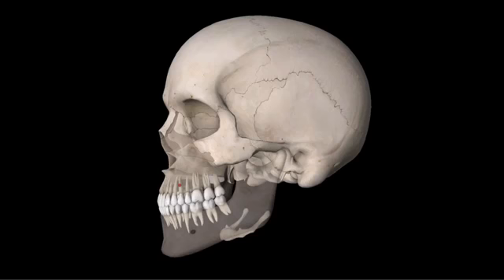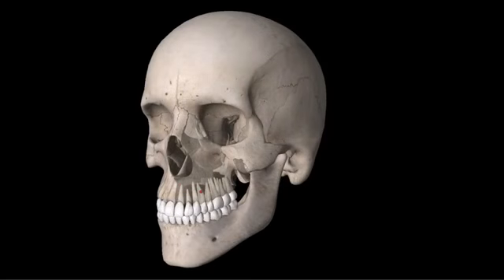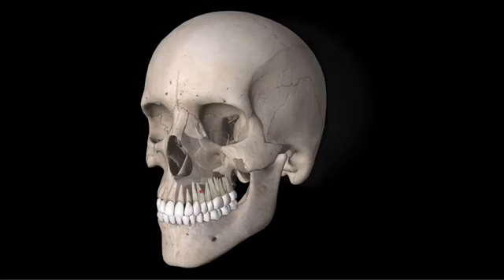Let us visualize this in 3D. Here is our base image, and as we move more mesial, showing more anterior teeth, the buccal side is going away from us and the palatal or the lingual are coming towards us. Do you see this? Let's repeat this again.